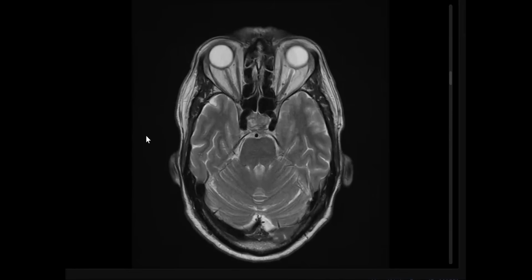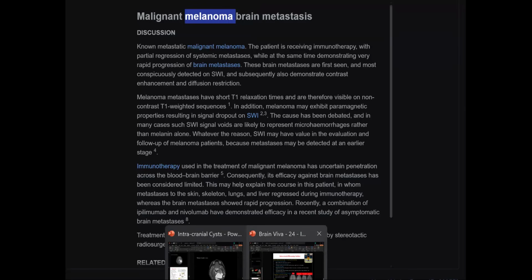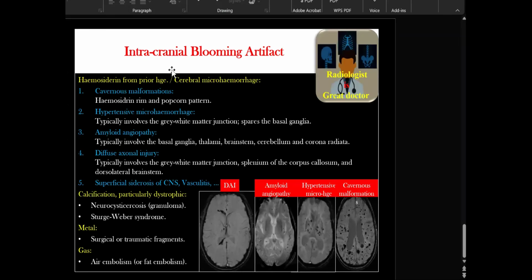What type of metastasis sends hyperdense hemorrhagic blooming foci? Melanoma, especially renal cell carcinoma, thyroid, melanoma. Okay, you said less likely. It may be centered upon the pituitary. But I noted it only on one side, that's why I omitted it. No problem, we are revising here.